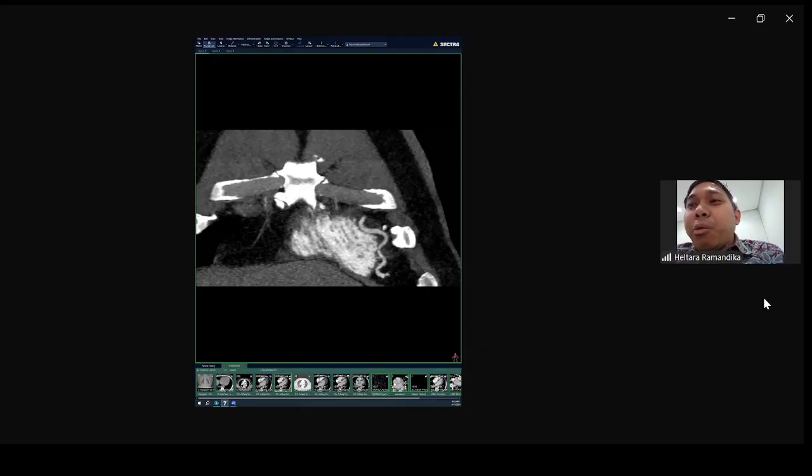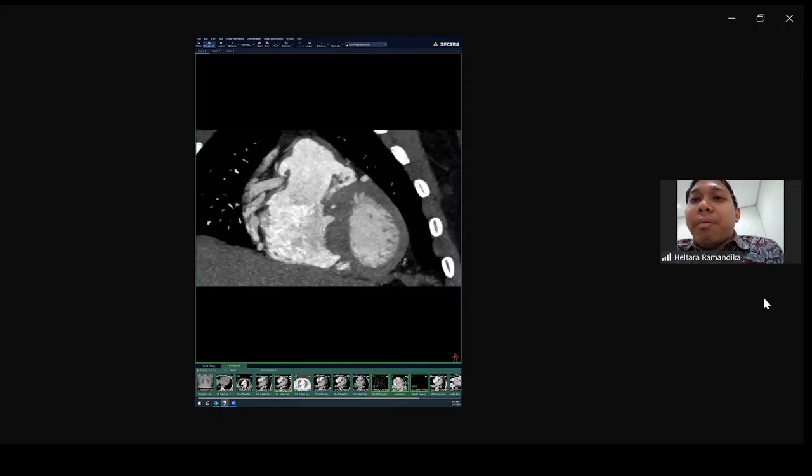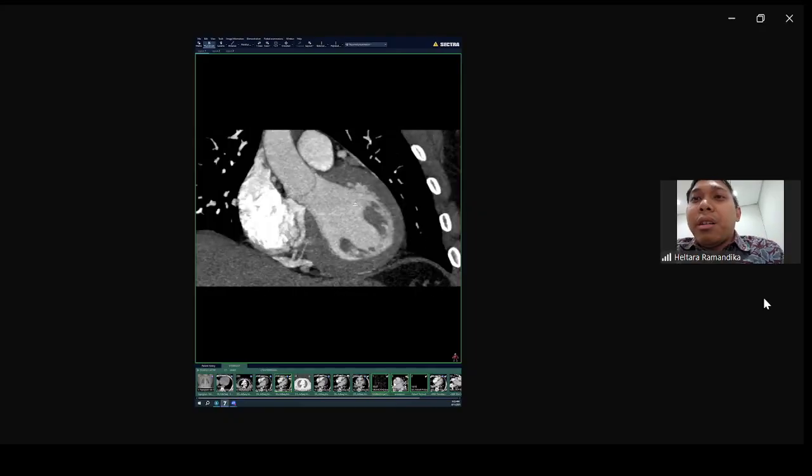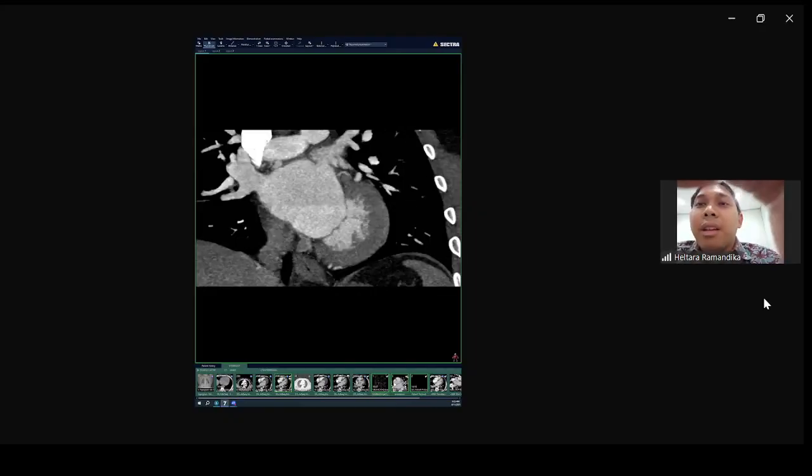You know that there will be a fistula between the heart and the pulmonary circulation. So if you just order a normal coronary study, you may look at the coronary with left heart enhancement, so you will trigger the contrast when it reaches the aorta. What did you do in this patient?